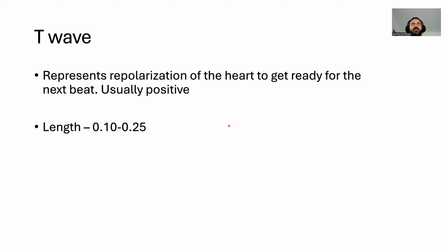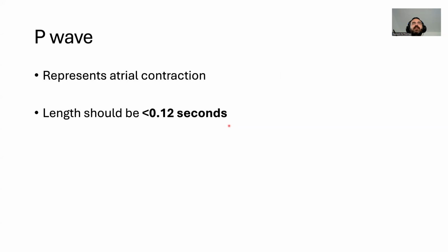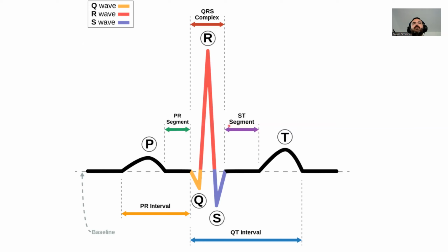Just a little bit of advice I can say. Usually the T wave has a higher magnitude than the P wave. Not always, but it should usually. It's also, again, longer. Something else that I want to point out, and it's going to come up again as we go over some other rhythms, some arrhythmias, some dysrhythmias, and hopefully you can use this to figure out some of them on your own.